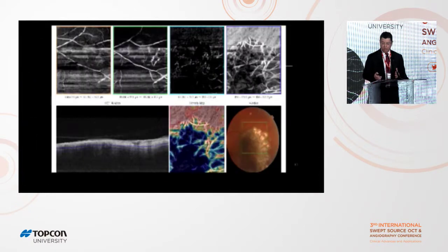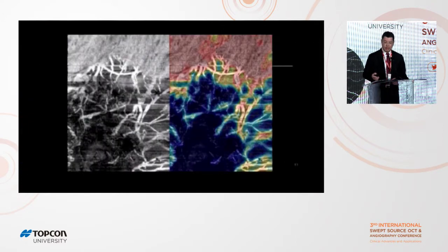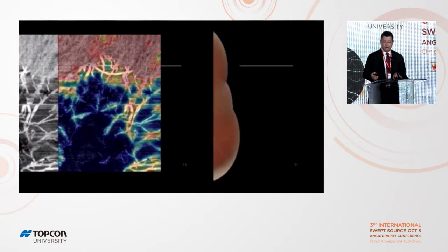And the OCTA demonstrates that there is a vascularity that we could study depending on the pattern, and we're looking at a lot more cases to try to correlate these patterns with growth and also with the possibility of metastasis. And this hyper-reflectivity of the vessels probably can again be correlated with prognosis. Again, the center tends to be more hyporeflective in these lesions.